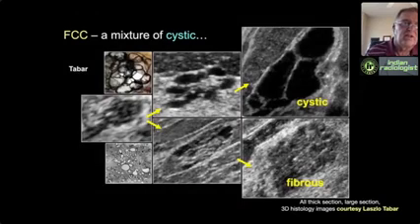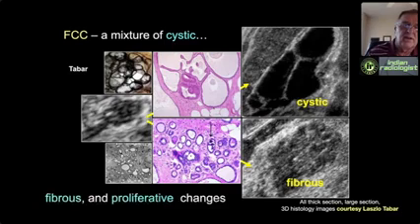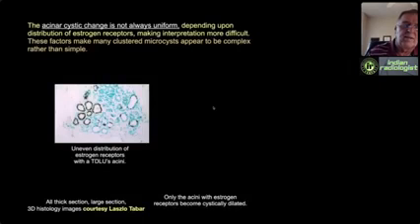Now, fibrocystic change is not just cystic change, but usually includes a mixture of benign proliferative disorders like usual duct hyperplasia, apocrine metaplasia, fibrosclerosis, whatnot. So if we go down the primarily cystic pathway, it's easier to call things benign. If we take the bottom pathway, where there's more benign proliferative things, it's harder to call something benign. We come up with more false positives. And again, it's usually a matter of the microcysts being too small to resolve in some cases. In other cases, they're larger and more easily resolved. So what makes this difference?